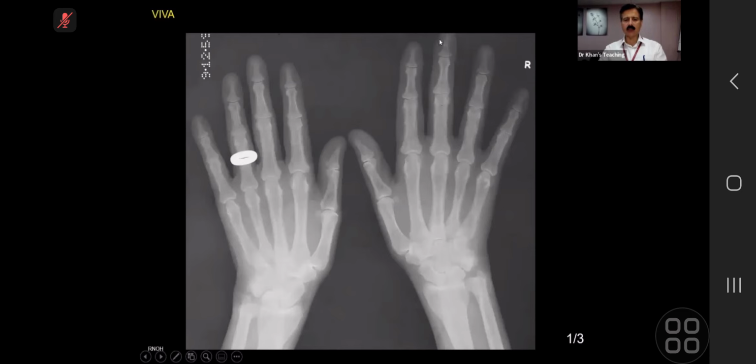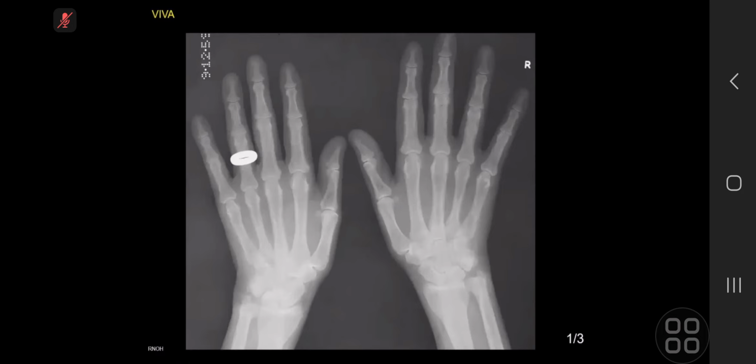You have picked up brilliantly. Well done. Acrosteolysis. Hyperparathyroidism can cause this. Excellent, excellent. Well done. Any other stigmata of hyperparathyroidism? Yeah, there's subperiosteal bone resorption of the right second and third. Excellent. I'll take over. Well done.